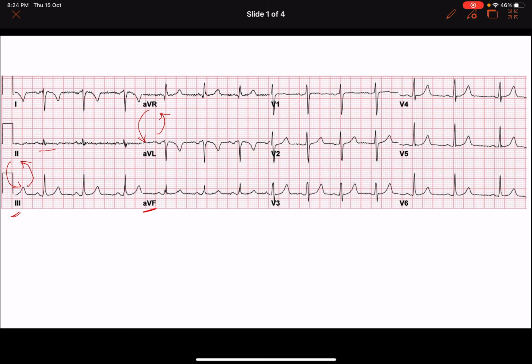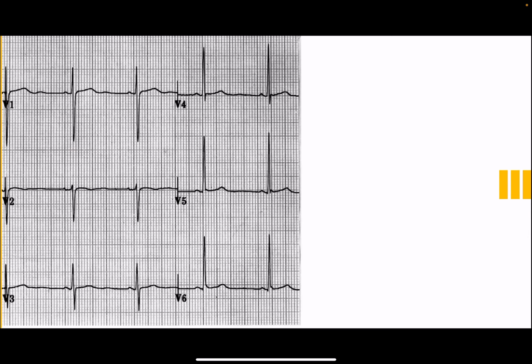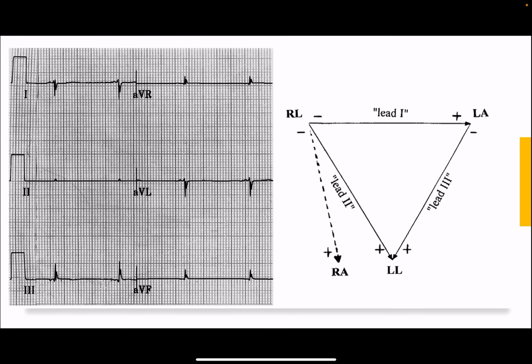And also I don't want to discuss much here on the arm to leg reversal, but I'll tell you very briefly in order to avoid all the confusion. See this ECG here. Whenever in an ECG you find one lead completely isoelectric, see how lead 2 is appearing, it's almost isoelectric with very small complexes.